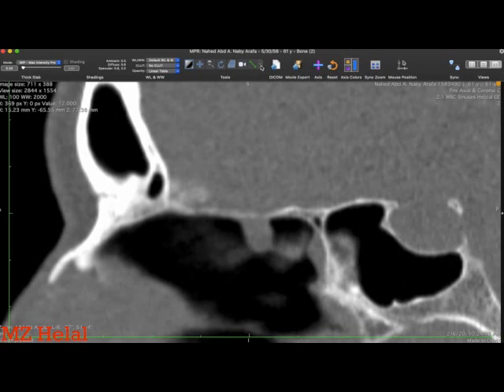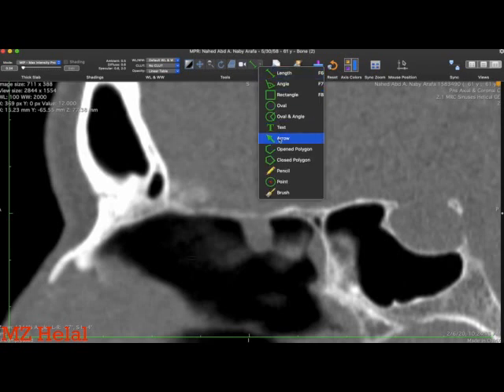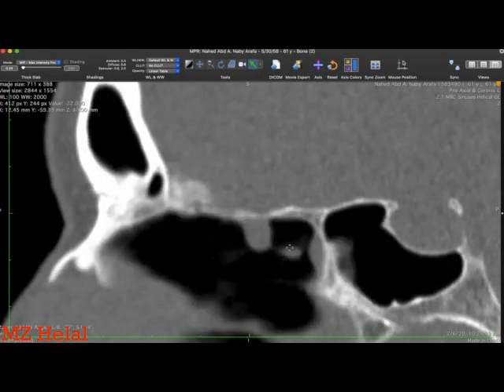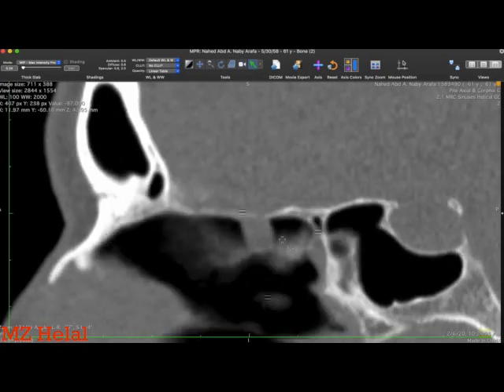So this is the herniated portion, and the defect is just this area, which is tiny, starting from here to there.